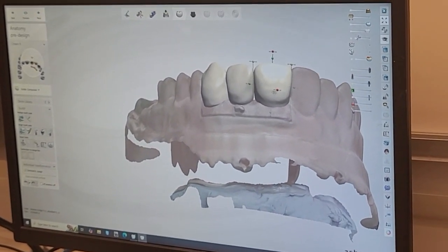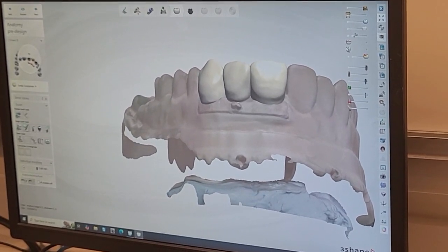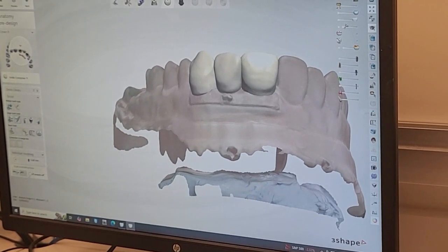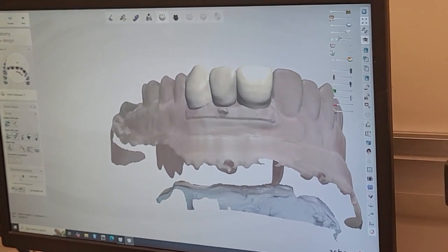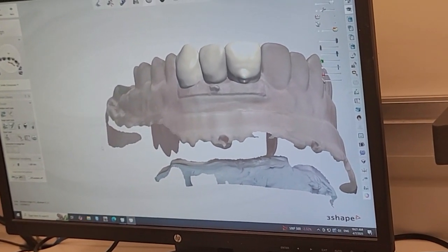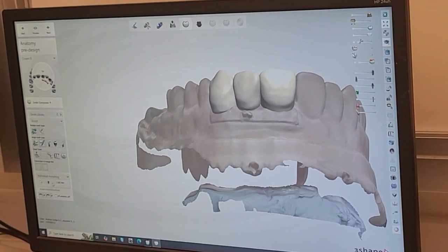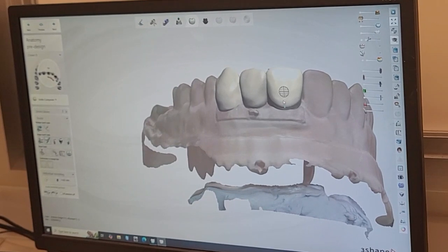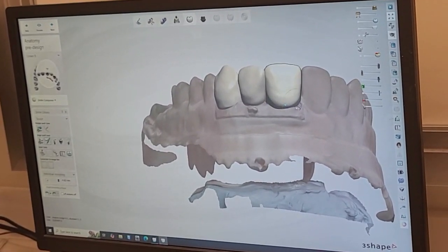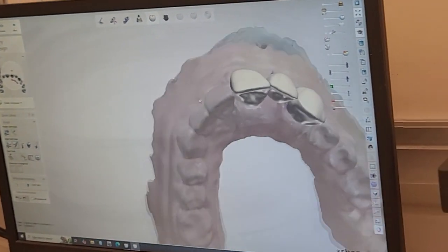So you can spend a little bit of time on this. Then you can modify it by surface. If I click on that, see, I can modify by surface. I can use that circle to be smaller if I want a smaller area, or you can always undo. Or I can make this larger. See? I can drag this down a little bit to make it look like this too.